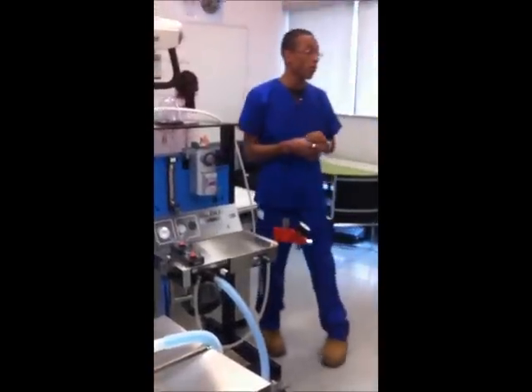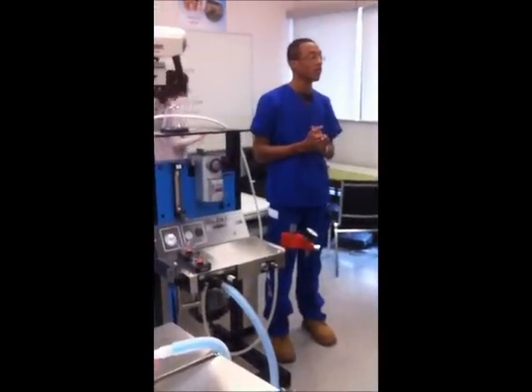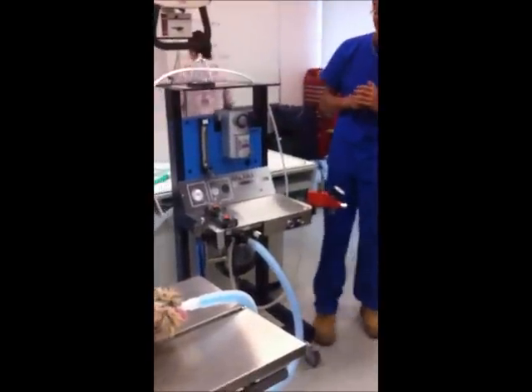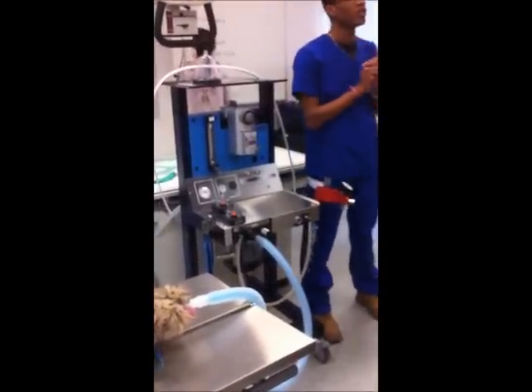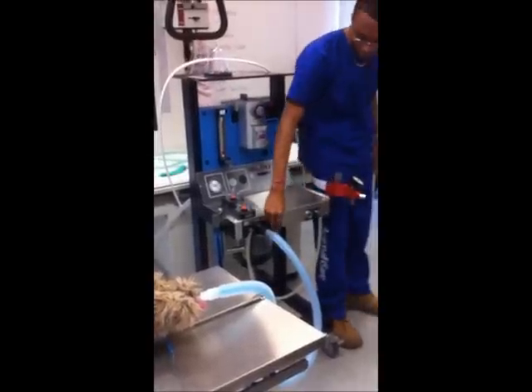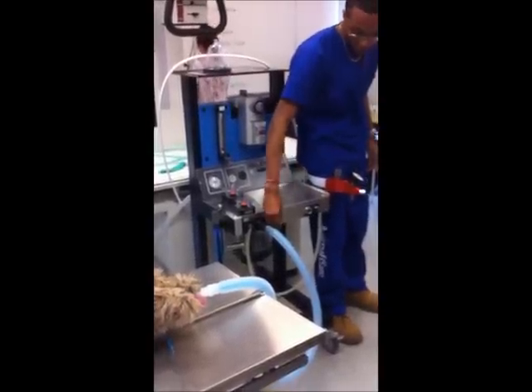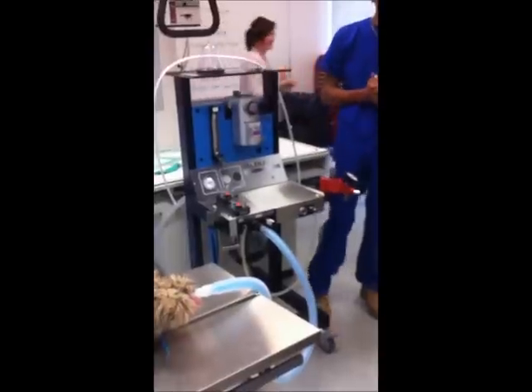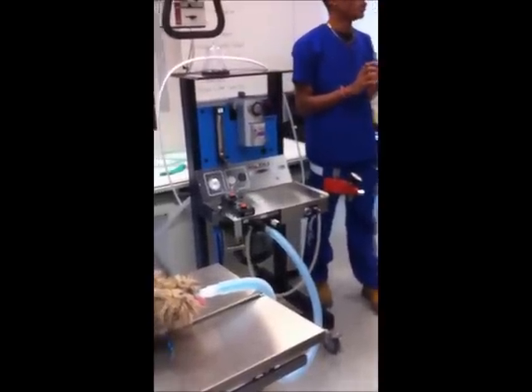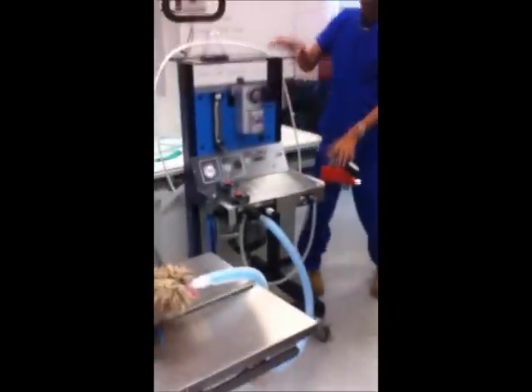So what is the next stop for that waste gas? Doesn't it go in the scavenger? Not just yet. We have one more stop before that, something that actually controls. The pop-off valve. Perfect. On the rebreathing system, we have the pop-off valve here. What does it do?